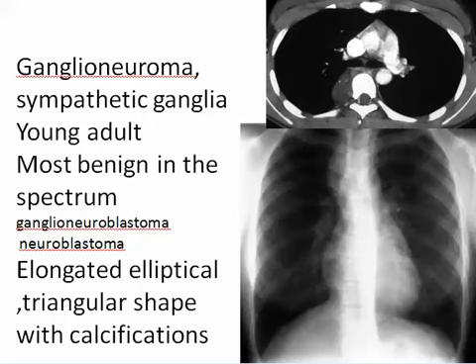Here is a posterior mediastinal mass. It is seen in the chest PA as a paratracheal opacity of well-defined outer margin. If the opacity is wavy and bossy, this would be lymph nodes. If smooth and continuous, this may be a benign posterior mediastinal mass.